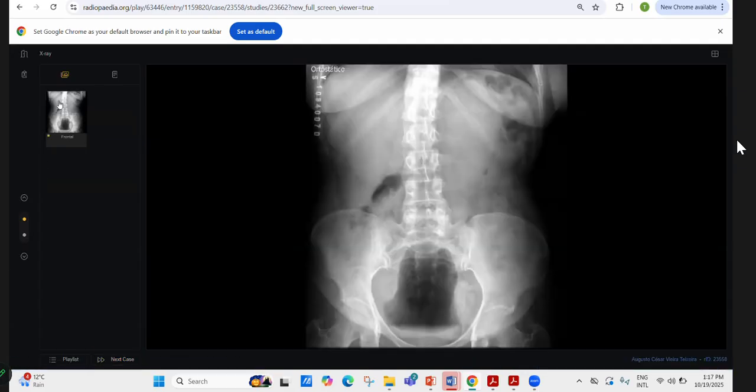Okay. I'm presented with the frontal abdominal X-ray in a skeletally mature patient, in which I can see a significant amount of air in the pelvis with a probable air fluid level in the dependent part. I wonder if this is air within the bladder. I would like to ask the history of the patient. There is mild scoliotic deformity of the spine. The patient has degenerative changes, is diabetic and 80 years old.